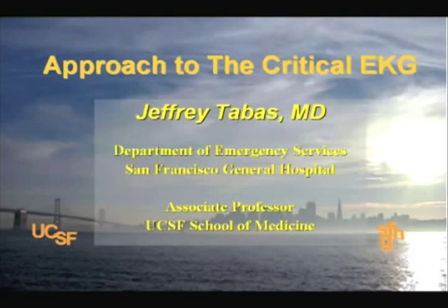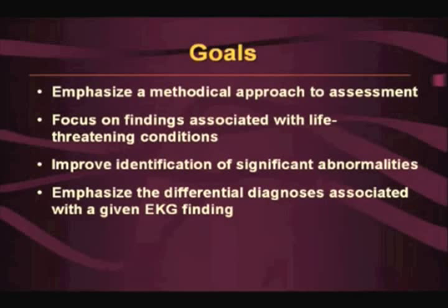Welcome to Approach to the Critical EKG. Goals. So we're going to emphasize a methodical approach to assessment. We're going to focus on findings associated with life-threatening conditions. We're going to improve our identification of significant abnormalities. We're going to emphasize the differential diagnosis. So I've tried to distill down, it's still a lot, but it's more like 50 or 75 things that you keep in mind to improve your acute reading.